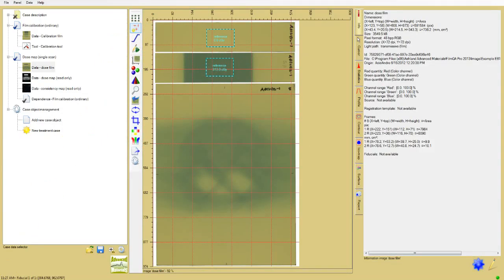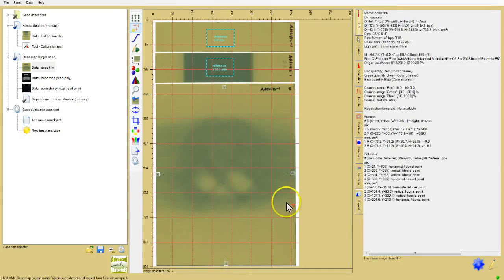Since the fiducial marks are near the centers of the sides of the films, the software senses whether a particular point is to be fitted in a vertical or horizontal direction, but you could force a specific selection if needed. Now point and click on each mark in turn, and the highlight marks appear. Fiducial fitting is done using the center of the highlight marks, not the marks scribed on the film. For precise positioning, click on a highlight mark, hold down the Control key, and use the keyboard arrows to move the mark.